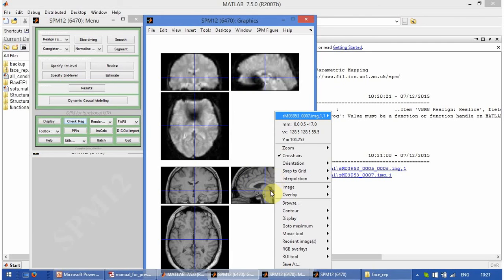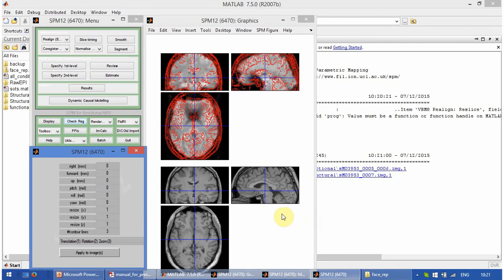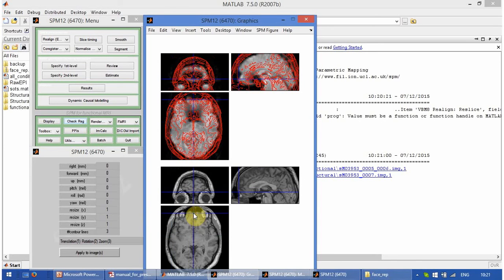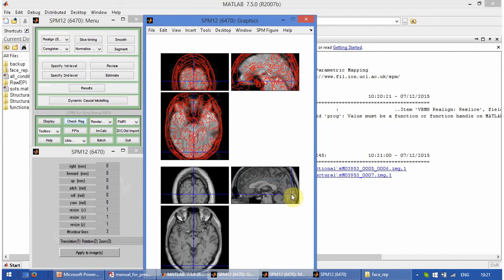In order to project the contours of one image into the other, we right-click on the image which we have to project, select Reorient Images, and click on Current Image. As we can see, those two images fit each other very well. But do they fit well the canonical template?